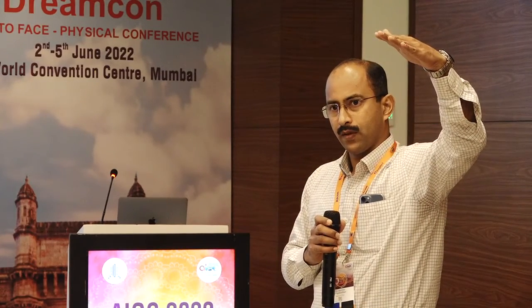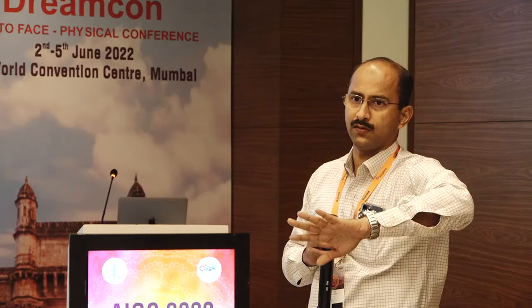But the point is, a machine that is costing you 25 lakhs and a machine that is costing you 80 lakhs is a reason in between. And it's not just the 50 lakhs for nothing. The tracking hardware is everything that matters in a machine which can stretch the limits of imagination. The tracking and the speed are the two things which make a difference between using OCT for progression in glaucoma and just OCT for the first time diagnosis.